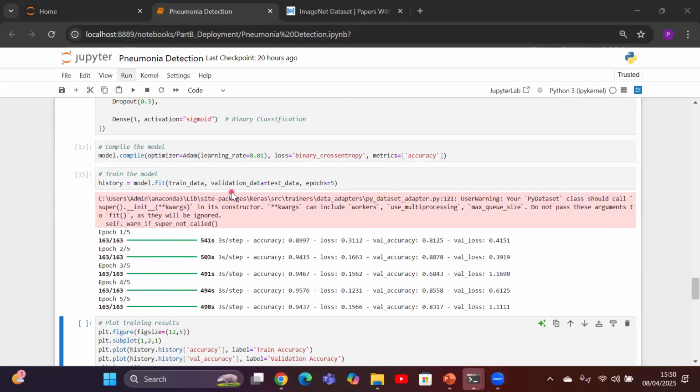And we are back after the training. It's almost how many minutes? 5 epochs at roughly 500 seconds each, 5 times 500, 2500 seconds, less than an hour. This is what we call training. And you can imagine for simple data of around 3000 plus images, we got around 50 minutes. So imagine if the data is very large, the computation time is going to increase like anything.